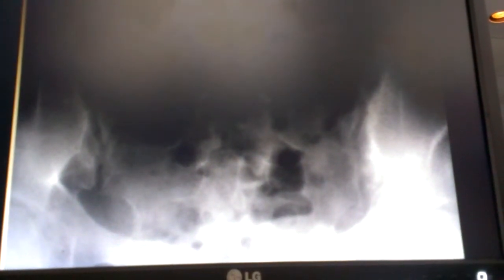I mean, those are all possibilities. What you don't want it to be is like an inflammatory arthropathy, like ankylosing spondylitis, right? Because those are the early signs, is the widening of the SI joint, especially the anterior SI joint, and the sclerosis on the ilium side. Why do we get sclerosis on the ilium side?